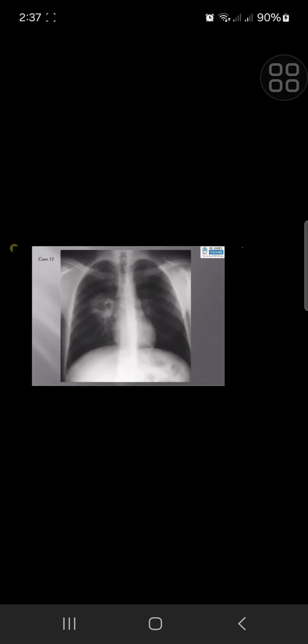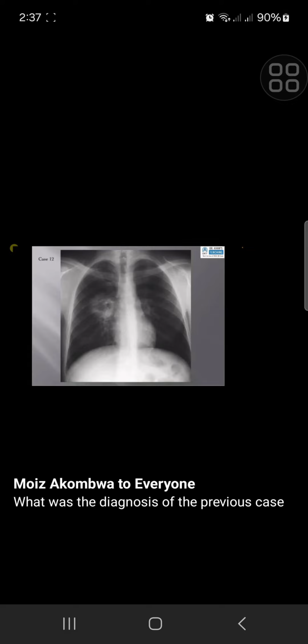I've got a frontal chest radiograph of an adult patient, and the most striking abnormality here is that there is a cavitating lesion projecting over the right hilum and mid-zone with peripheral consolidation and an air fluid level. This has ill-defined margins laterally. The left hilum and the right paratracheal stripe are also within normal limits. The heart size is normal and the lungs are otherwise clear. There's no subdiaphragmatic abnormality and there's no bone abnormality either.